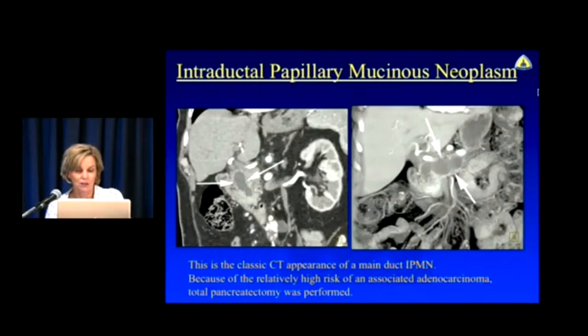Okay, here's another classic main duct IPMN. The main duct is expanded. This one's, again, about 1.5 centimeters. You can follow it throughout its course. High chance of there being a cancer in these patients. Remember, up to 40% in some studies.